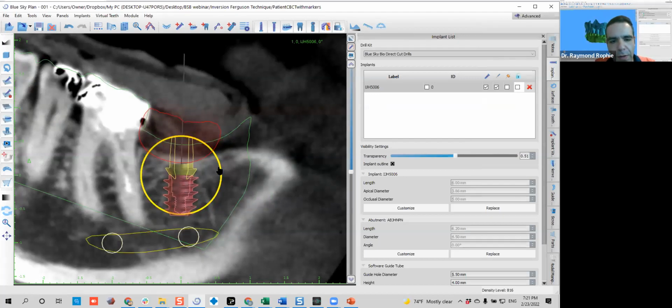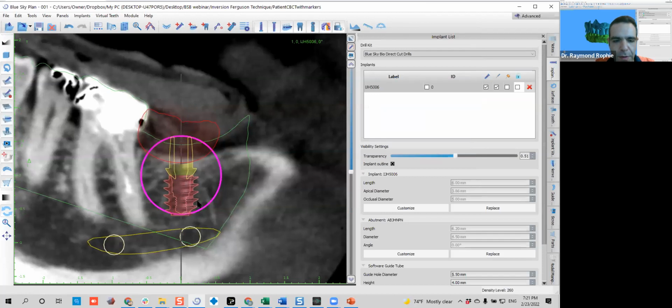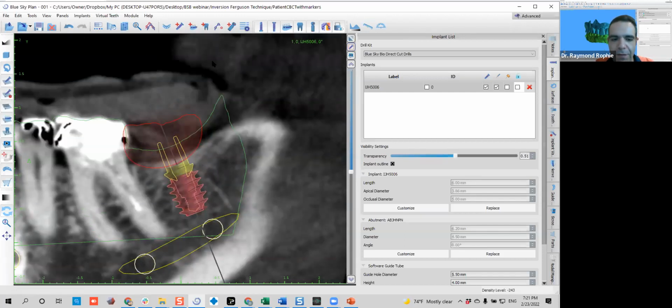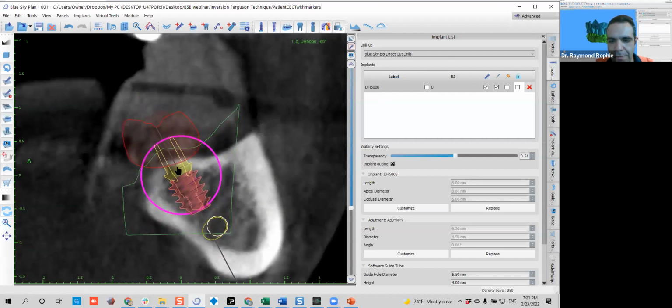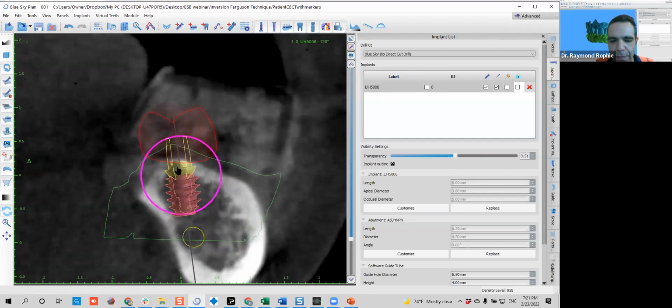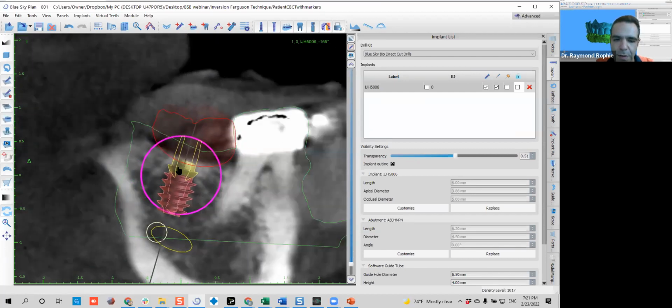Lately, what I've been doing is, there is something that I need to mention. Here on the tangential view, where you see the 360 degrees of your implant, there are two ways of using it. One, by having the view with the axis on the curve, but this view gets me a little bit dizzy.